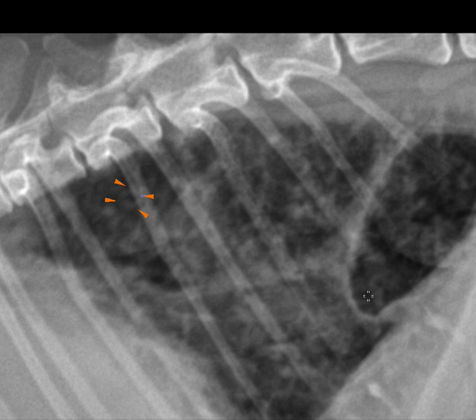and when is it just maybe the normal appearance of the pulmonary tissue? Well, one thing that I like to look for is not only that the rings are visible, but that they're thick. The wall of a normal bronchus should not be this thick. So we're not just looking for lines and rings or donuts and railroad tracks, but we're looking for the thickness. Here's another example where the walls are thick.